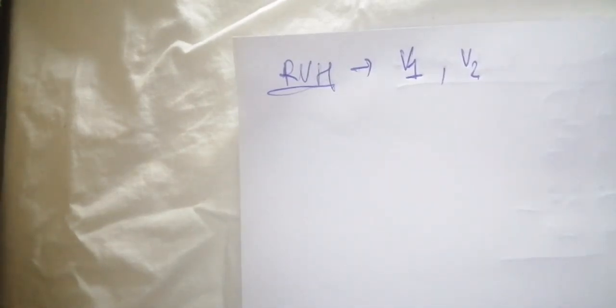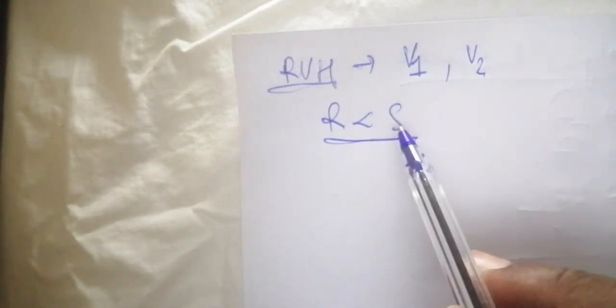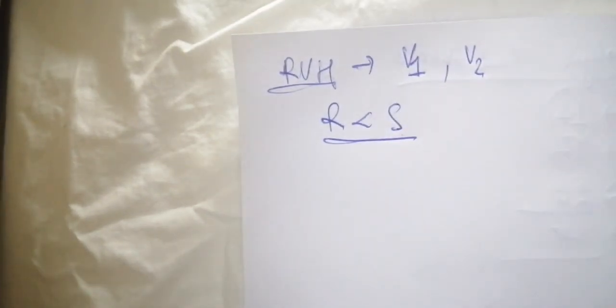Now, after the atrial enlargement, we have the ventricular enlargement, particularly called ventricular hypertrophies. Let's start with right ventricular hypertrophy. To visualize right ventricular hypertrophy, generally we use lead V1 and lead V2. Normally, the amplitude of the R wave is going to be less than the amplitude of the S wave on the V1 and V2 chest leads.